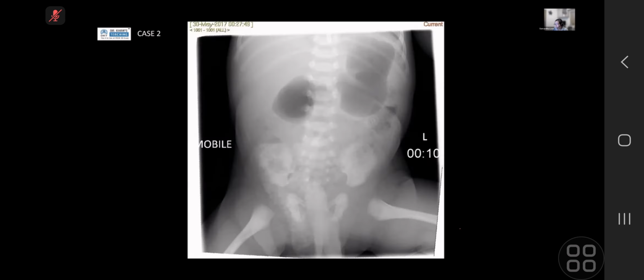Surgeons will take over. Now the third case is the one where, as pediatric radiologists, you probably want to sit up a little bit more and say, hey, we are not going to leave this alone. That's because there is a presence of distal gas, which means that things have gone through or are going through, but now the patient is unwell. Why is that so? Is it because they have started to have a volvulus or a malrotation, causing something more sinister?